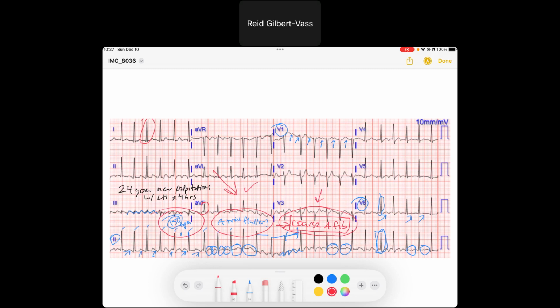So this 24-year-old is sitting in one of your ER rooms, and what are we going to do? I thought this was a good case to see how we can manage this AFib. We know that with narrow complex tachycardias, if they're unstable, we would sync cardiovert or shock.